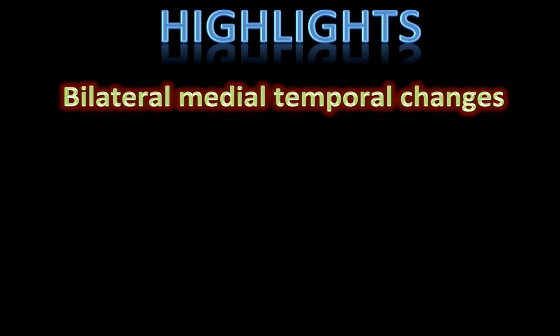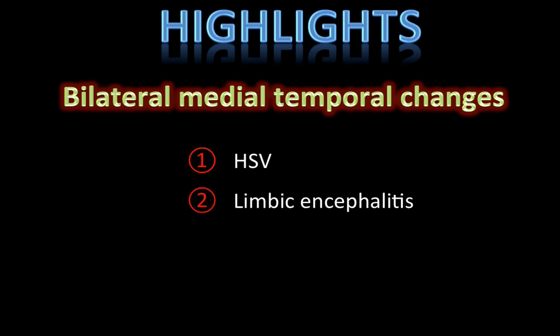Another thing to highlight is to know this classic differential diagnostic list. So when you have bilateral medial temporal lobe changes, the classic differential entities would be herpes simplex encephalitis, limbic encephalitis, or better called autoimmune encephalitis, and status epilepticus.